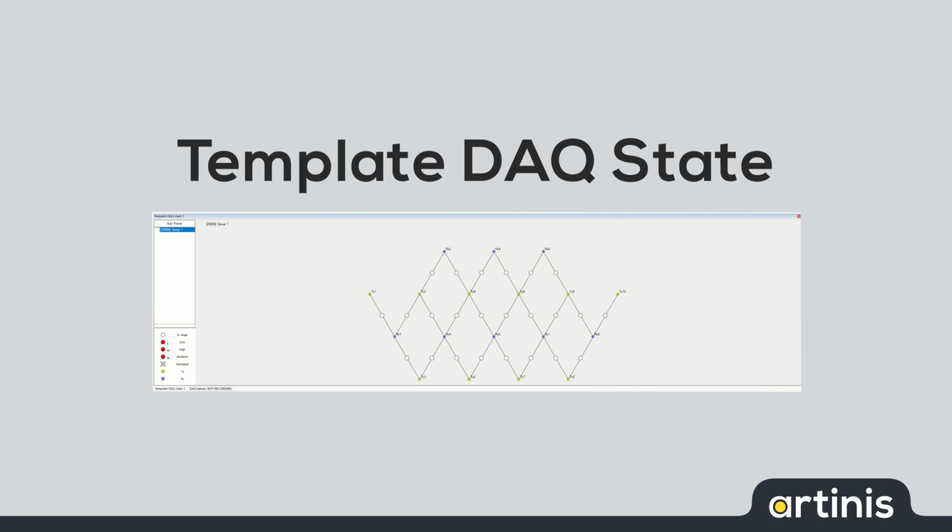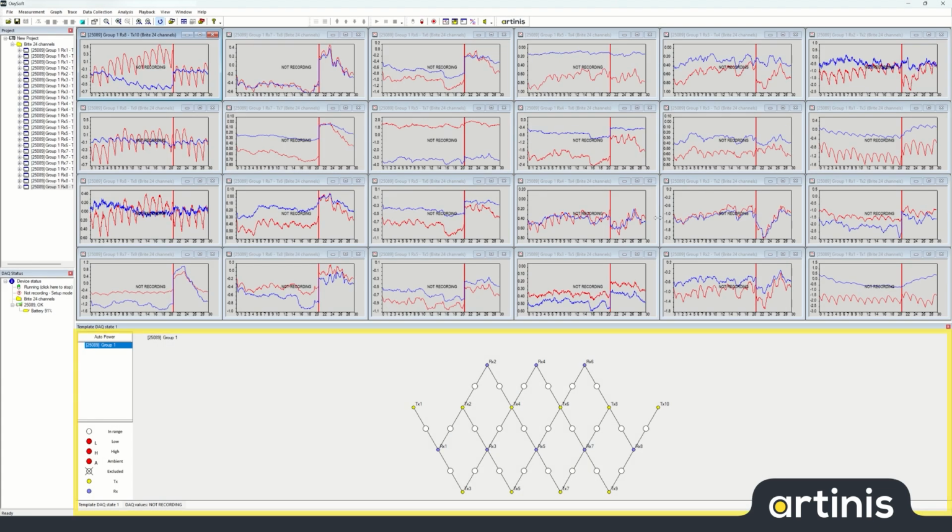In this video, I will explain the Template DAQ State and its use in our data acquisition software OxySoft. The Template DAQ State displays the Opto template for each connected device.